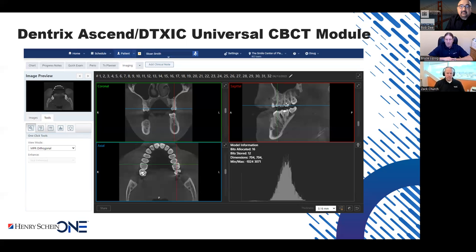So I look at this as really, really valuable. Let's say you want to diagnose a tooth for patients having pain. You want to see if there's any infection at the tip of the root. For diagnosis, it's great, but as you said, storage. It's in there and you can access it from anywhere without beefing up your computers to be able to handle it. In other words, your expensive acquisition computer for your cone beam, you don't have to take that home, you know.